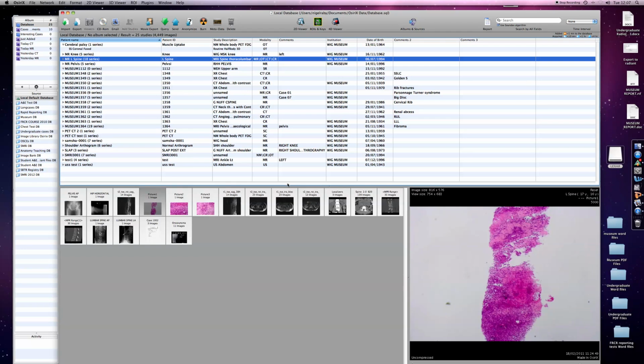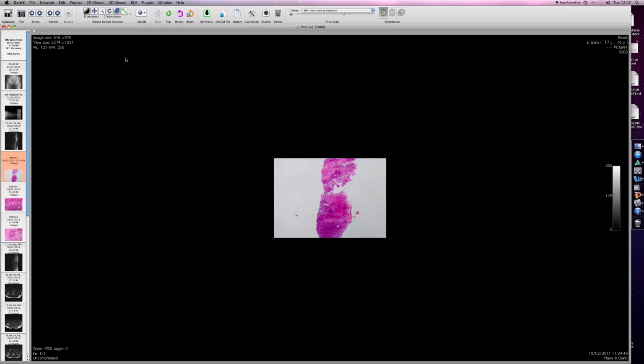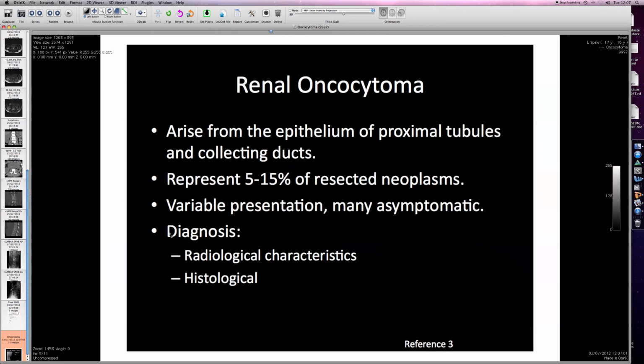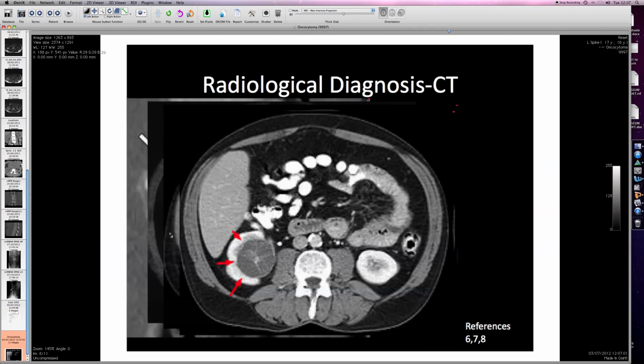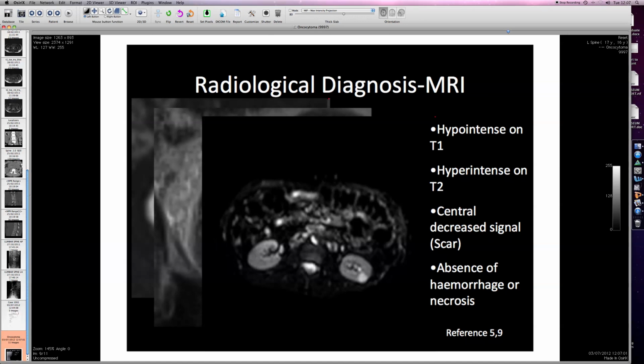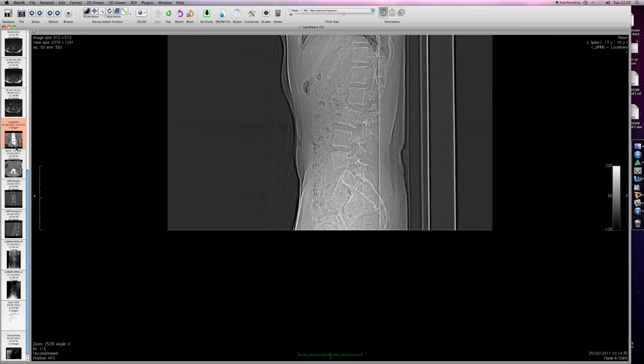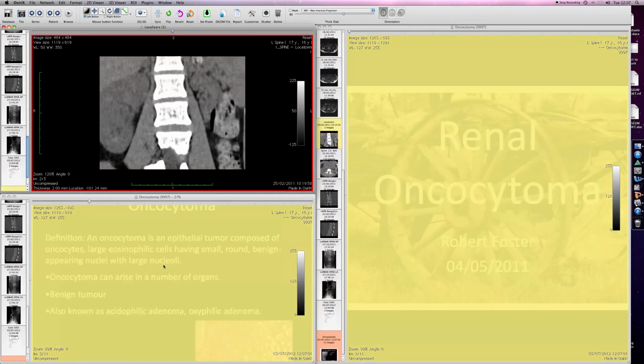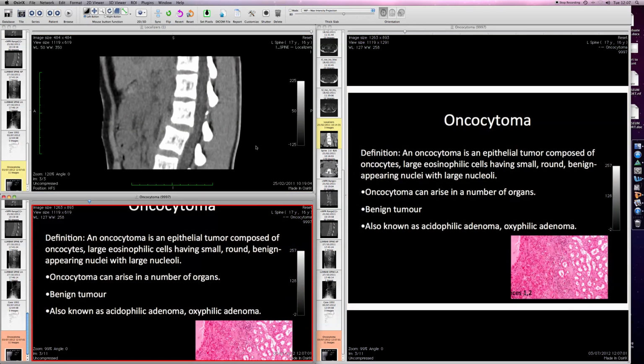Open. That one for some reason has popped straight in without any need to merge it. And that happens from time to time, and I don't know quite what the rules are. However, if I click on that, then I have a PowerPoint type presentation saved as a PDF file, and obviously if that was relevant to the case, you could have it up beside an image so that you could look at the images and look at the PDF file at the same time.